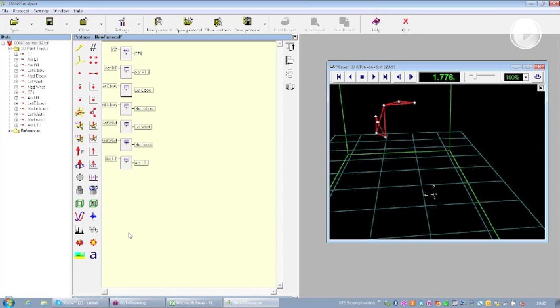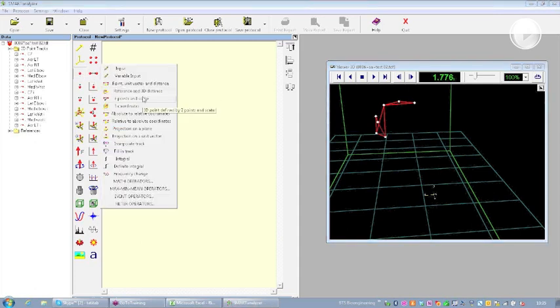To do this, I need to know which markers I'm going to use, and I need to split the distance between the markers in order to have another point in the middle. So first of all, I need to find the operator that allows me to create this medial point. So I look over 3D points and I look for 2 points and a scalar. This allows me to create a 3D point defined by 2 points and a scalar.